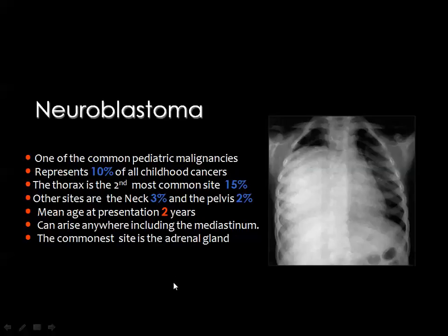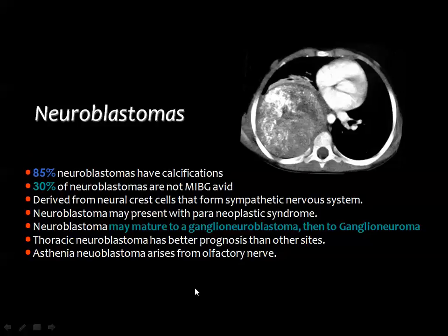after the adrenal gland. Neuroblastoma is a big mass in the posterior mediastinum, and one of the clues for a mediastinal pathology is the compression of the lung, meaning that this lesion is outside the lung, compressing the adjacent parenchyma. Calcium is present in neuroblastoma and detected in about 85% of cases by CT. And this neuroblastoma may have an extension inside the spinal canal.